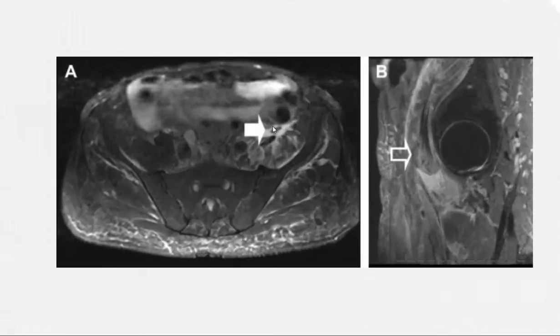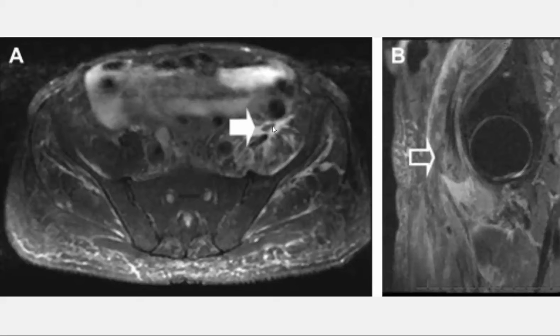Here we talk about abnormalities related to the iliopsoas tendon. Abnormalities of the iliopsoas tendon include tendinopathy, tendon tears, the internal snapping hip, and iliopsoas tendon impingement. Now, the iliopsoas compartment is an elongated extraperitoneal space that extends from the posterior mediastinum to the hip joint. You have a composite iliopsoas muscle which exits the pelvis under the inguinal ligament, and its tendon inserts onto the lesser trochanter.